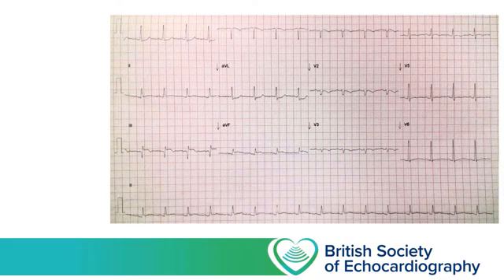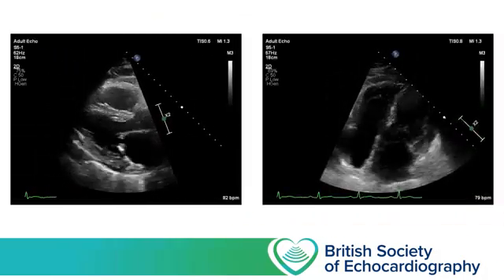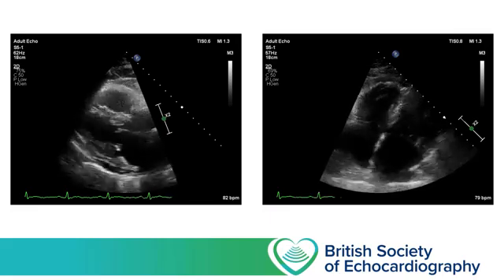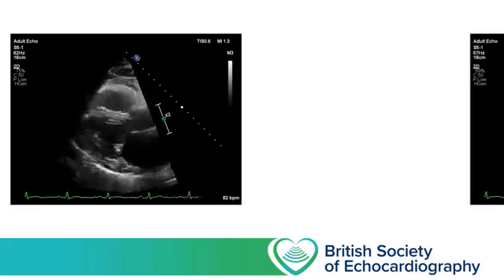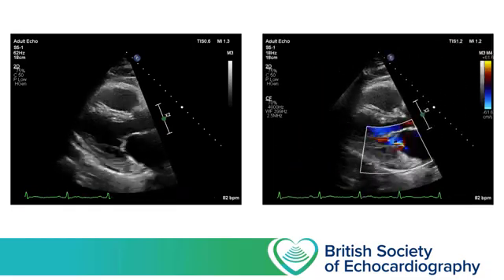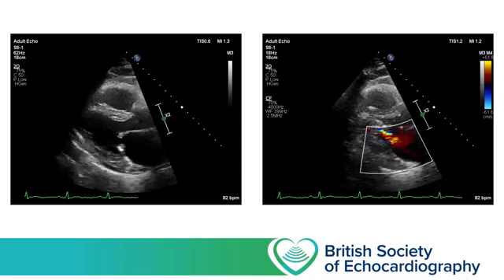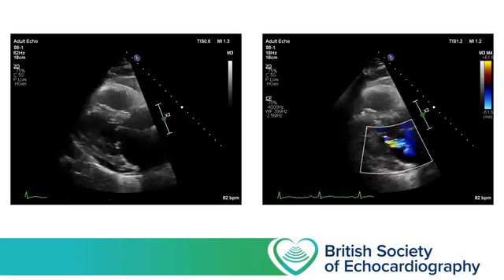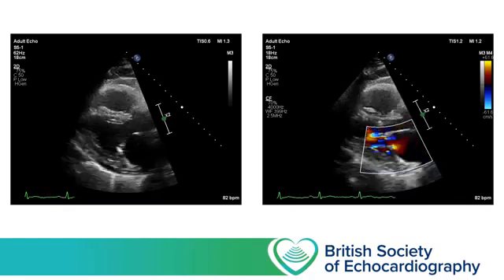She underwent immediate PCI but several days later deteriorated and became shocked. 2D echo shows us that the LV function is not too bad, whilst the RV is slightly dilated and is impaired. New hemodynamic collapse occurring several days after a myocardial infarction should lead us to actively consider mechanical complications, and in the context of an RCA infarct, posteromedial papillary muscle rupture would certainly be something to consider.